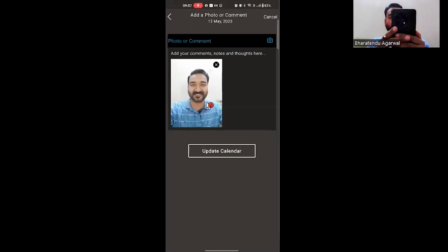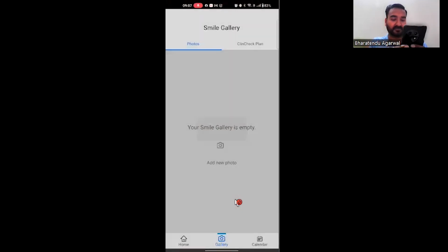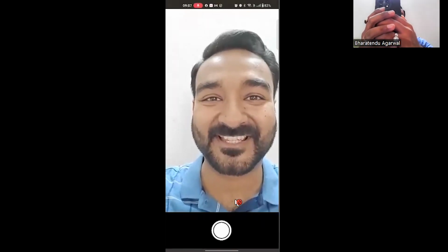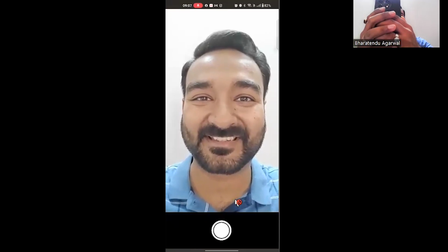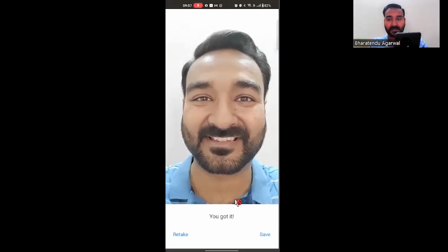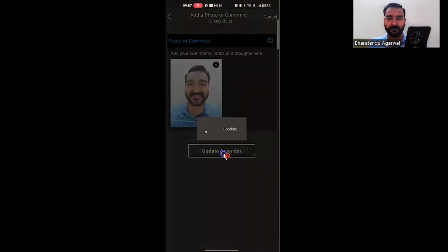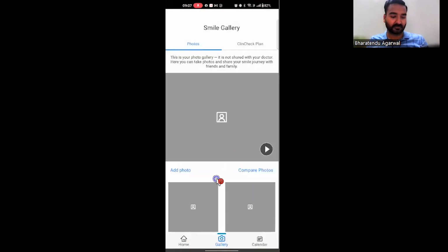All right, yeah, let's put in one more. Do we want to put a comment? I don't know. Let's just take one more picture. Let's cancel this. Add new picture. Yeah, I like this picture better. Let's save it. Now update my calendar. All right, so what does it do? It's taking some time, I guess.